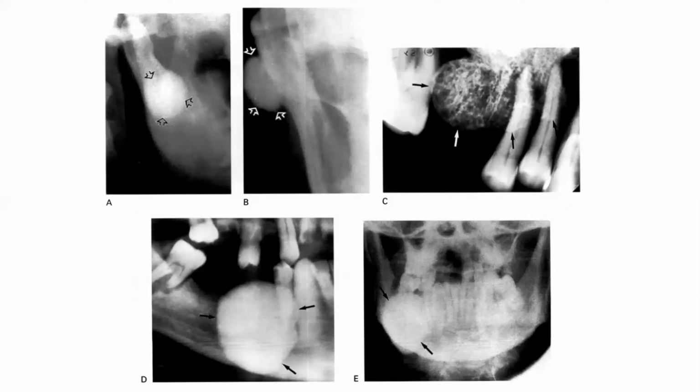Next we have osteomas. Osteomas of the jaw may be located in the medullary bone and thus called endosteal osteomas, or may be around the bone or on the surface as a pedunculated mass, thus called periosteal osteomas. They're usually detected in young adults and are typically asymptomatic. Solitary lesions are usual; multiple jaw osteomas are a feature of a rare inherited condition, Gardner's syndrome. Osteomas can either be compact or cancellous.